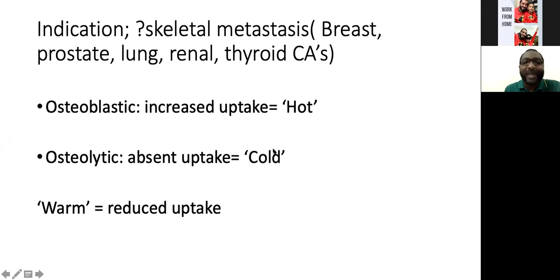Sometimes this happens in cold lesions. There are certain cold lesions that eventually will become hot lesions, so sometimes you will see the term warm lesions. Anytime you see increased uptake on a bone scan, it means that there is increased osteoblastic activity. This may be as a result of increased blood flow or increased bone turnover. If we talk about cold areas, it means that area is deprived of blood flow or osteoblastic activity, or both.